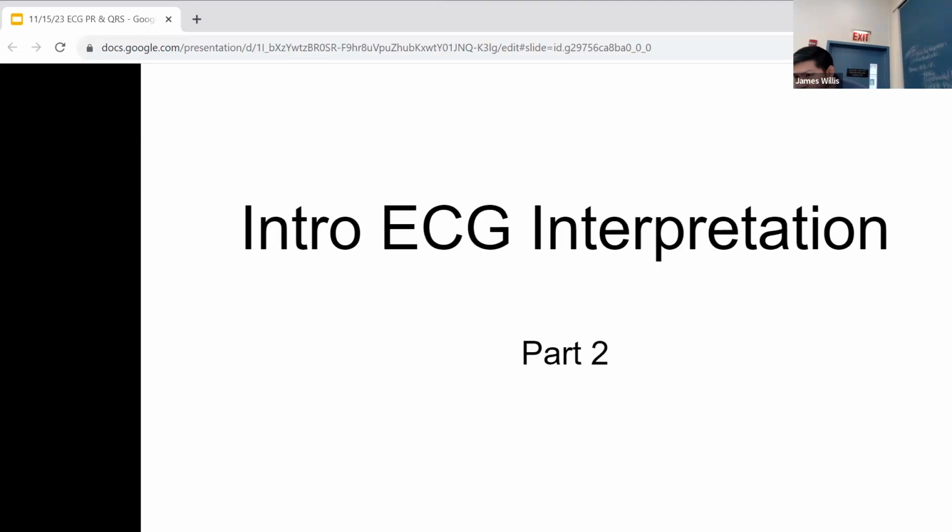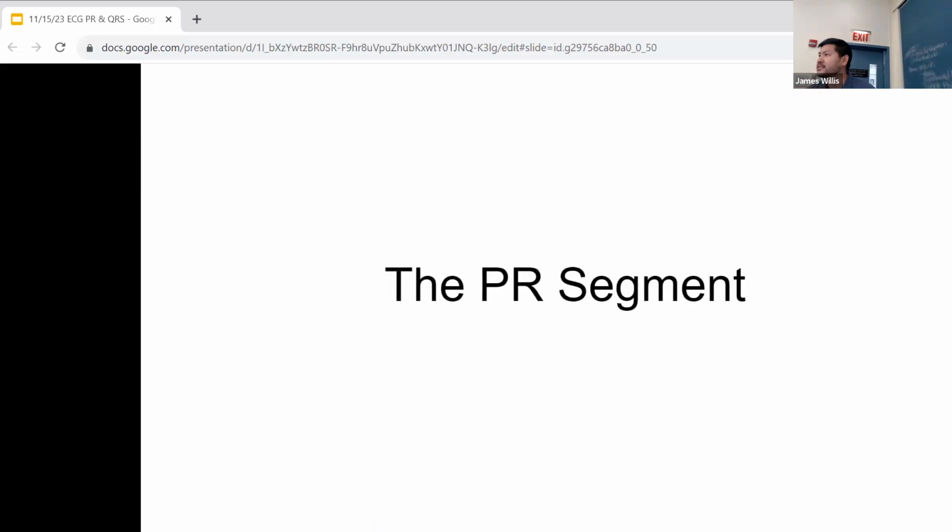All right, this is part 2 of intro ECG interpretation. So we're going to go over the PR segment. So graduate from the P wave to the PR segment.